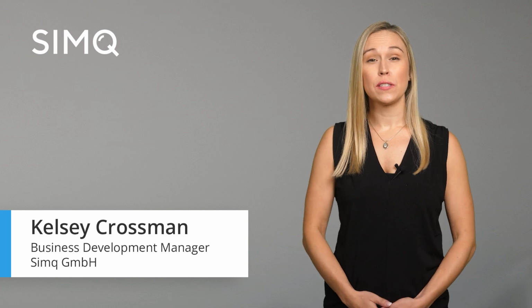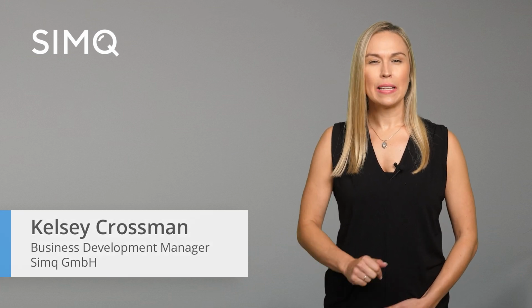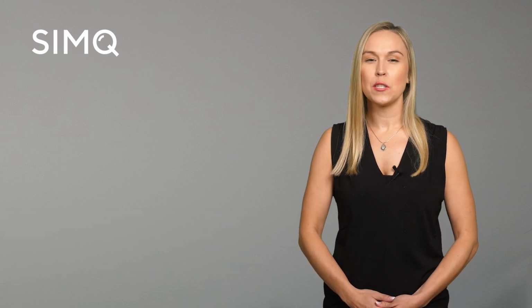Today, I will present our SimQ VIT software for virtual implant testing. Let me show you how SimQ VIT assists in verification, strength assessment, and safety of patient-specific implants. To start, we click the desktop SimQ icon to open the software. We can now set up highly complex biomechanical simulations for each patient within minutes.